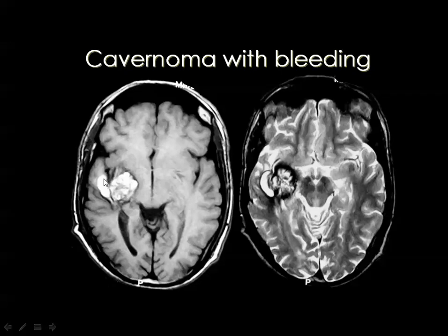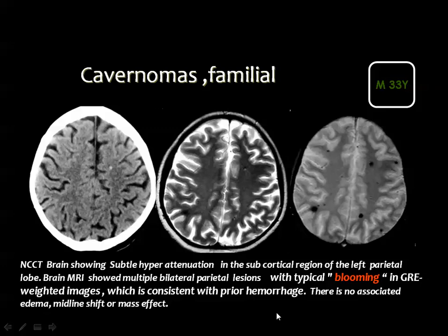The bleeding shows high signal in the T1 and high signal in the T2, denoting the subacute blood elements. And this is the cavernoma surrounded by the classic low signal rim of hemosiderin. Then the gradient image, gradient MRI, is very important for detection of minute cavernomas because of its sensitivity to hemorrhage.